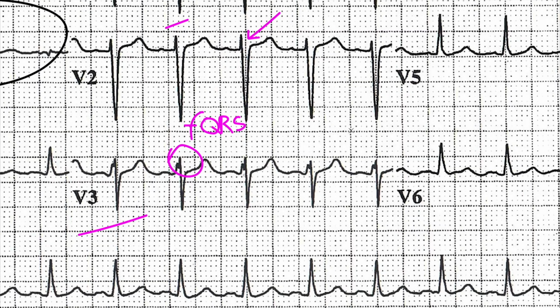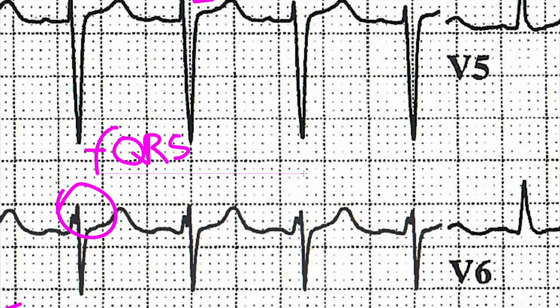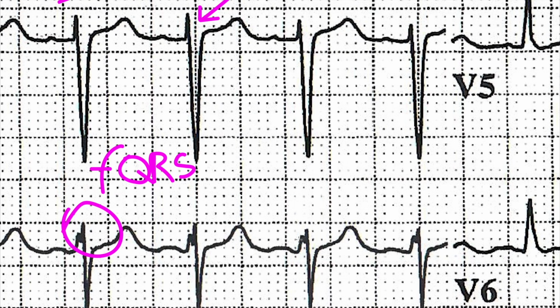However, I do want to take a look at the QRS, and what I'm going to do here. And by the way, in the clinical setting, you can't do this, right? Zoom in, zoom out. So what I do is I'll take a snapshot with my phone, and then I'll blow it up with my phone and take a look. You can do that. A nice little trick to use. So I'm just going to measure this up, right? So the first inflection in this fragmented QRS is correlating to other QRSs. The J point seems to be right there.